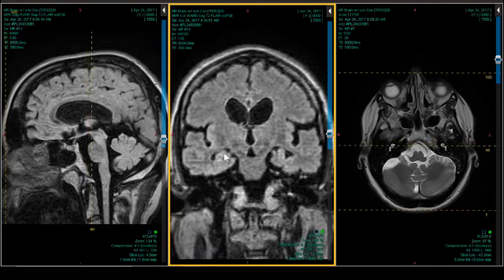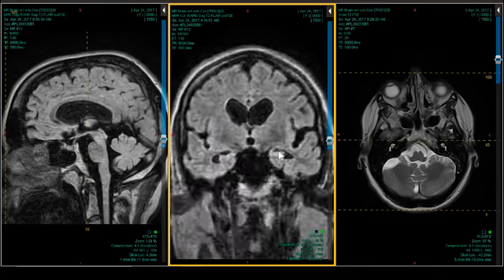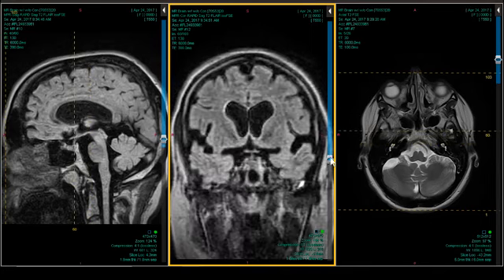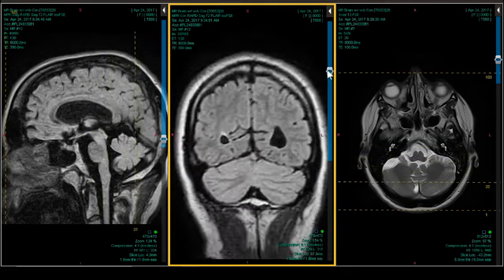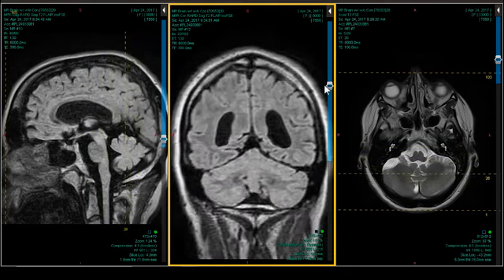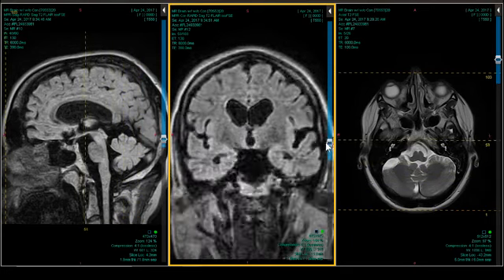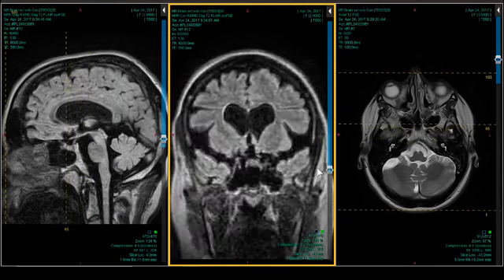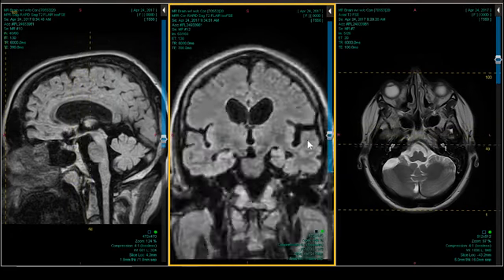It's a little worse on the right than left, but it's pretty juicy on the left. And in Alzheimer's disease, I like to see a pretty strong parietal pattern of atrophy, and I don't have that. I do have a very strong Sylvian pattern of atrophy and a moderate to strong pattern of frontal atrophy.